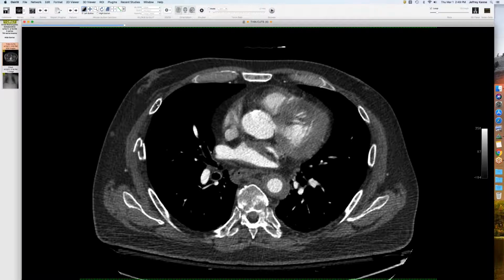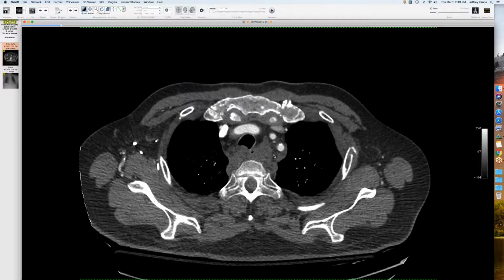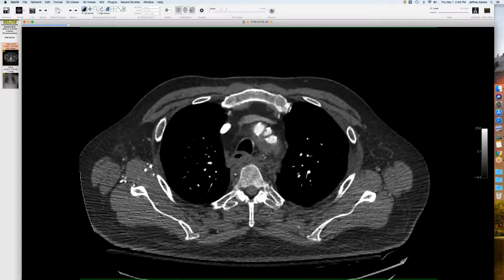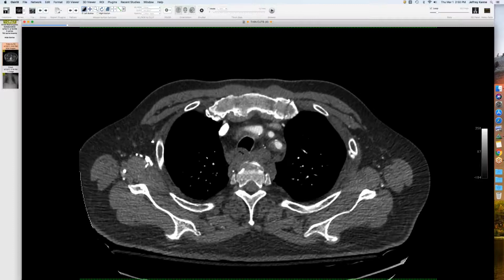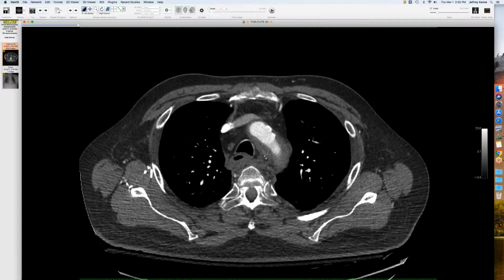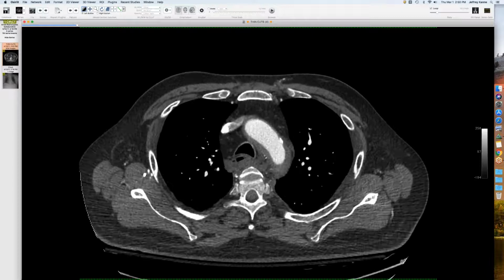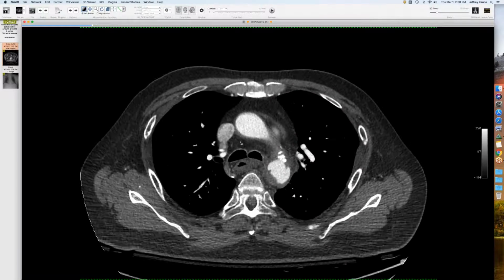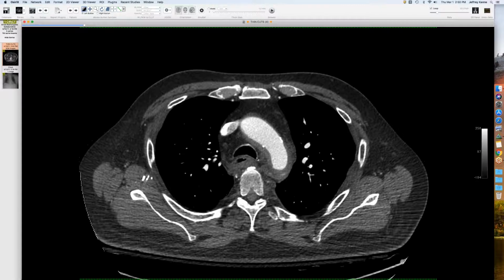So Jeff, you think that the hematoma that was paraspinal up higher was coming from his spine and not from this vascular injury? Yes, and what I can gather from the endovascular operative note, there was no extravasation when they injected their contrast, because there's this fat plane that persists throughout the whole scan, separating it. Because usually if you had a mediastinal hematoma, we'd expect a lot more blood. And it's right where his fractures are, and it doesn't track down or anywhere else. And all the other ones I've seen with extravasation fill the mediastinum pretty intensely. Right. Because there's really no tamponade effect at that point.